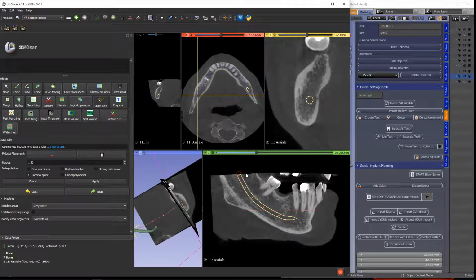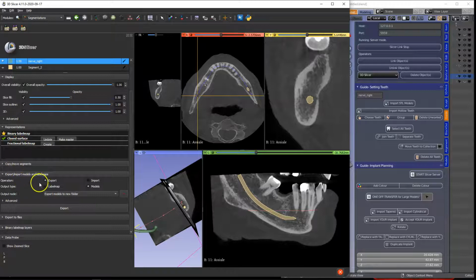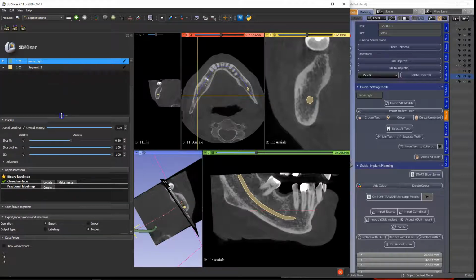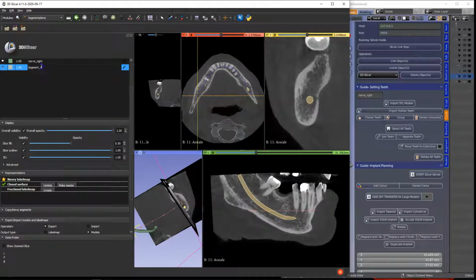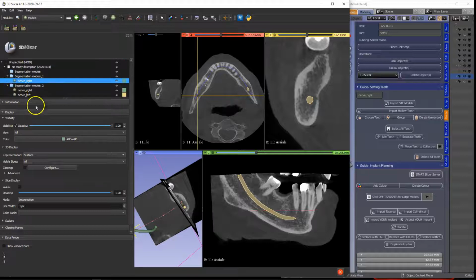And then right click to finish it, apply this, and then we're going to export nodes. Make sure you've got this. Actually, let us name it first. Perhaps that would be a good idea. We'll just type in nerve left. Okay. And we're going to export this. And then in the model maker, you should see nerve left. Okay, so you don't actually have to view this.